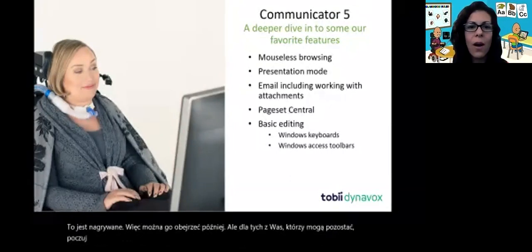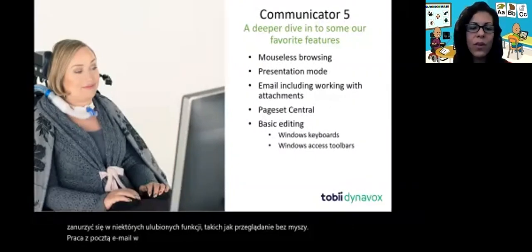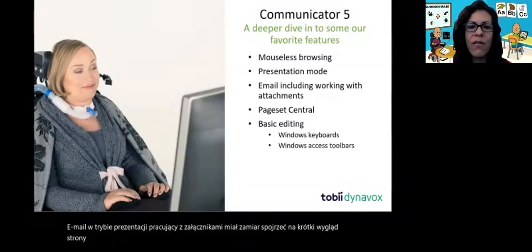We're going to take a little bit of a deeper dive into some favorite features like mouseless browsing, presentation mode, email, working with attachments. We're going to take a brief look at Page Set Central, and some extremely brief editing on the Windows keyboards.